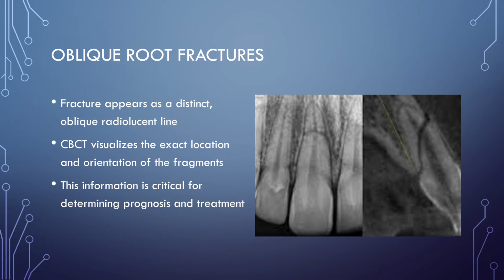Extracting this highly detailed geometric information from the scan is absolutely critical for determining the tooth's long-term prognosis and for making definitive treatment decisions, such as whether it is viable to attempt splinting or if you must proceed with extraction.